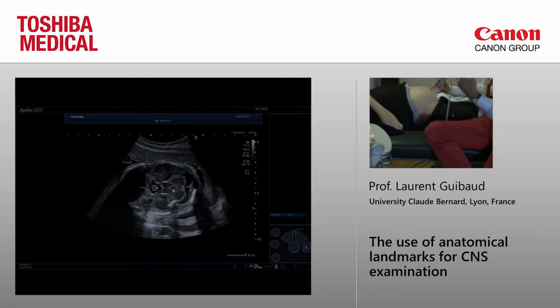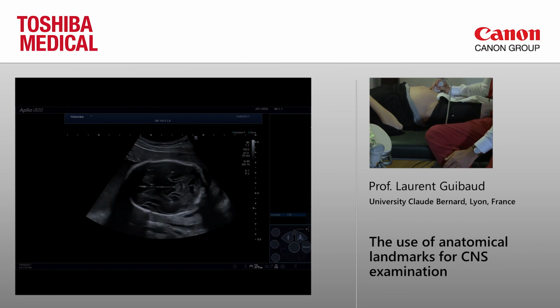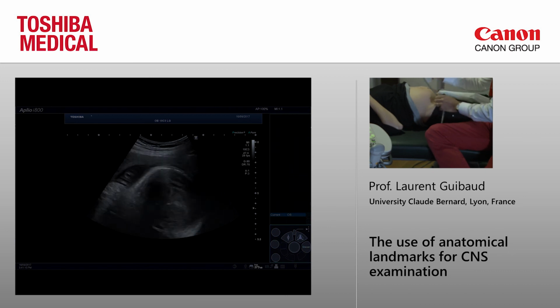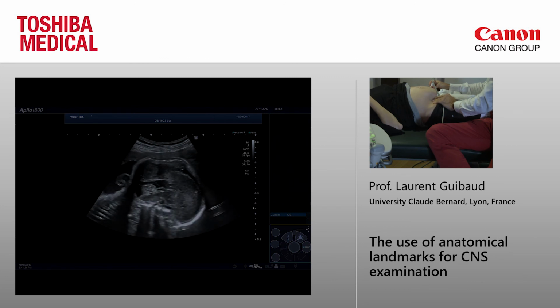Joubert syndrome, yes. So each time you have polydactyly or echogenic kidneys, look at the fourth ventricle to be sure that it's normal. If you see that the AP diameter is longer than the transverse diameter, you have elongation of the peduncle in a case of molar tooth sign, and it's Joubert syndrome. Okay? So if you have something wrong with the posterior fossa, you have to go to a sagittal view. So this is a little bit tricky in that case, but you see here.